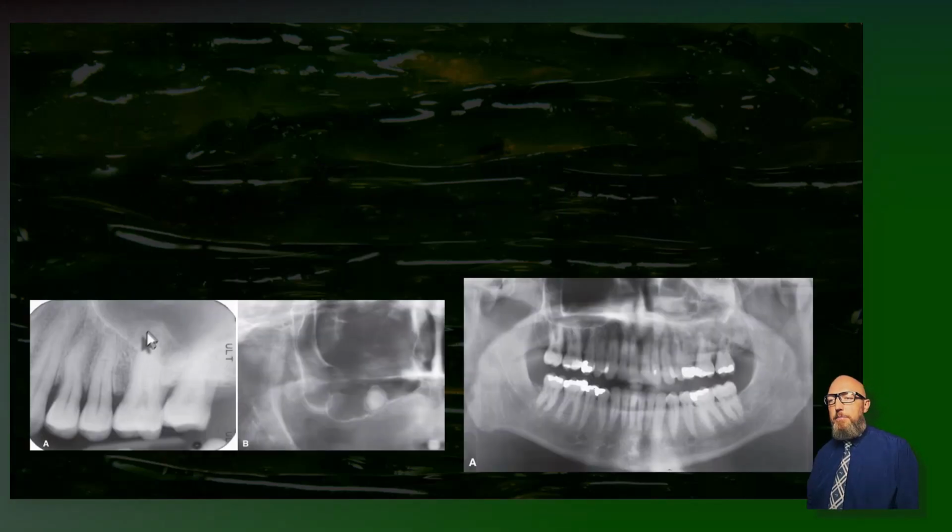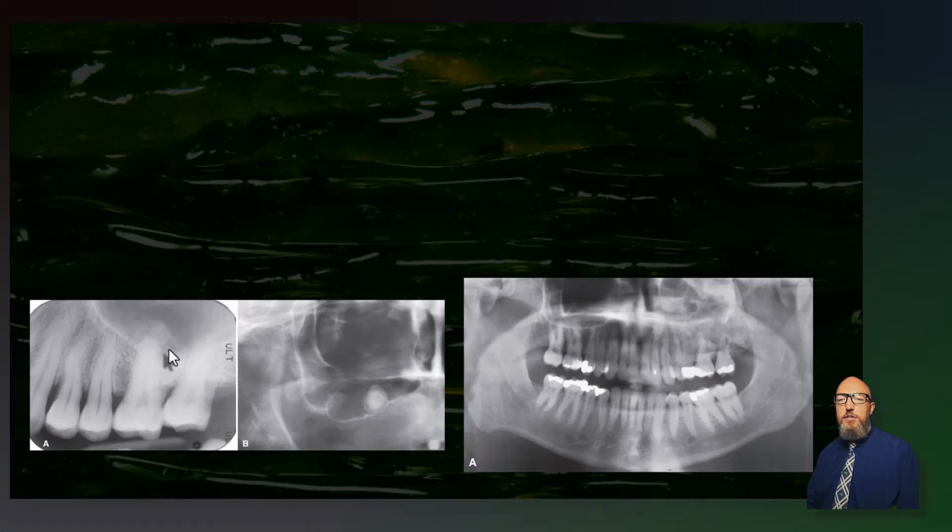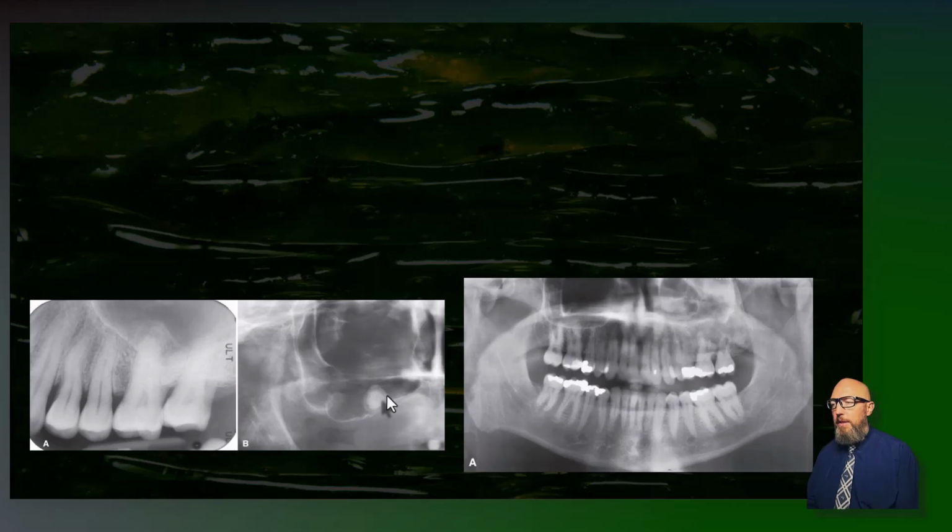What do we see here in this periapical image? Notice kind of a granular appearance. Notice the raised cortical outline, but it's kind of a mixed granular appearance. Radiolucency around the outside. This is just an osseous dysplasia that's expanding into the sinus. Now the osseous dysplasia has caused kind of a loss of that corticated border, but this is still just suspected osseous dysplasia. And here we have another well-defined opacity outlined by a radiolucency expanding into the sinus. Kind of looks like an antrolith, but this is, again, just a residual cemento-osseous dysplasia.